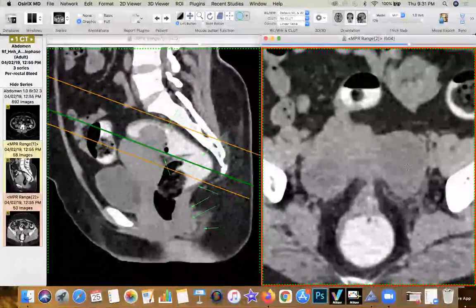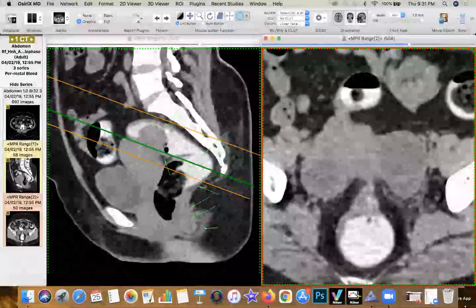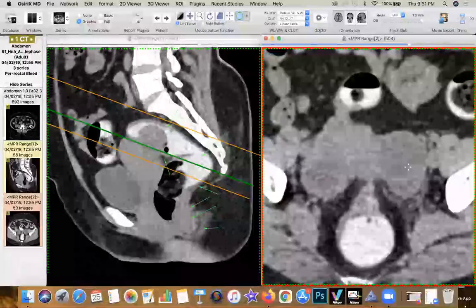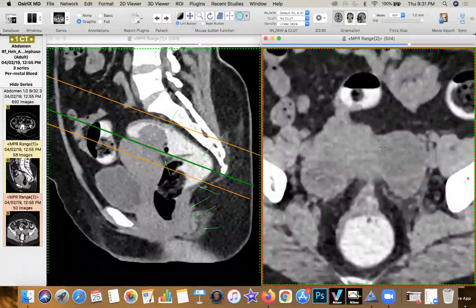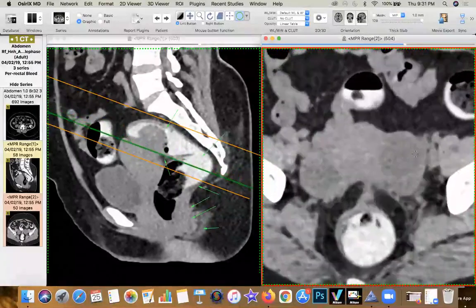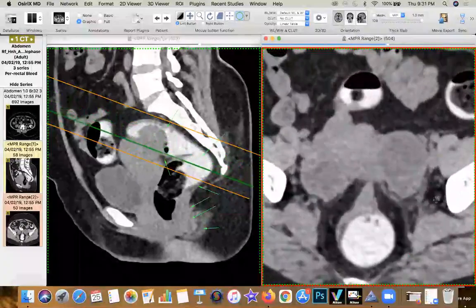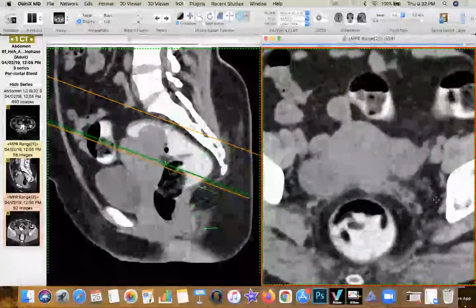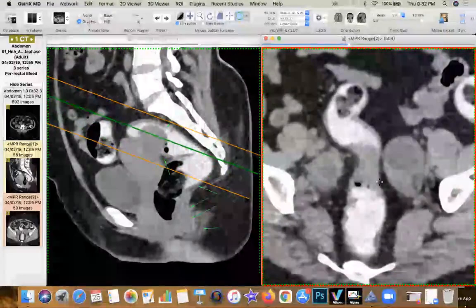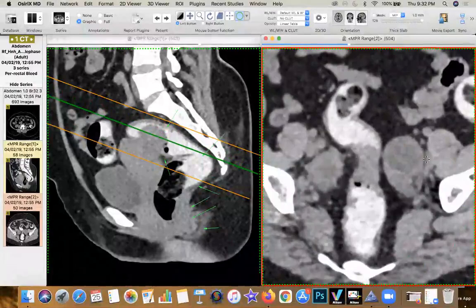Of course, in a minuscule number of patients, you don't want to be missing solid ovarian lesions which have mucoid matrix within, like Krukenberg's or even primary mucinous tumors of the ovary. So by and large, what you get to see right now in this patient is rectal wall thickening and bilateral adnexal lesions. You don't see the native ovaries separately, and you're not seeing any pelvic side wall adenopathy. Now that's pretty unusual. If you're going to start thinking this is rectal cancer of this size, you would start seeing nodes in the perirectal space, and you would start seeing nodes along the pelvic side wall with a lesion of this size.